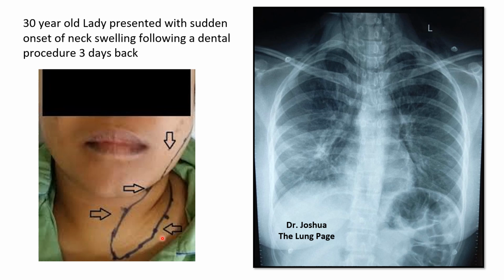So this is an image of how this lady presents. She presented with this side swelling, right? So we took a chest x-ray. The chest x-ray looks like that.